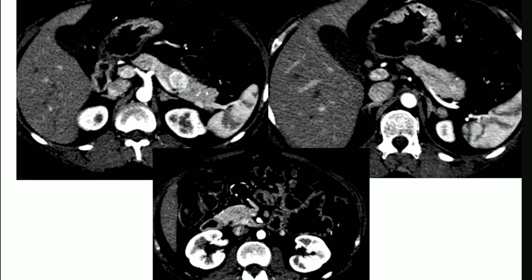However, no other such lesion is noted, and also in the liver, I cannot appreciate any enhancing lesions. The pancreas appears normal in its shape and feathery appearance without any fat stranding. No ascites is seen, the liver is normal, and the rest of the viscera appear unremarkable.